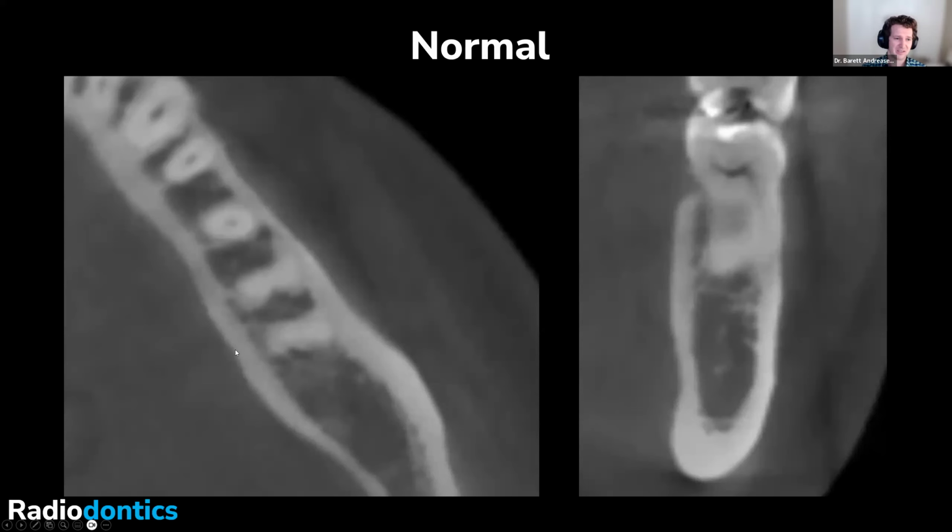So what I mean is that if we were to measure this and this was, say, 2 millimeters thick, we wouldn't want to move just a little bit more distal and all of a sudden it's just 1 millimeter thick, right? We don't want any cuts or scoops out of these cortices because that would potentially indicate that there's pathology present. And then obviously, same goes for the trabecular bone.